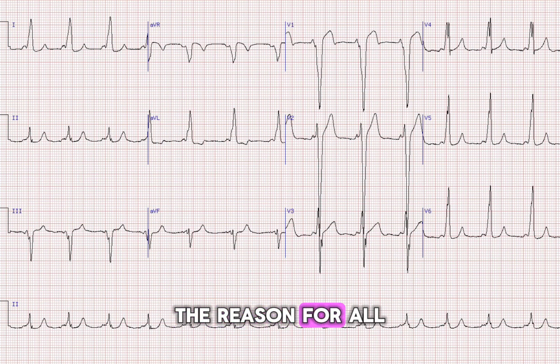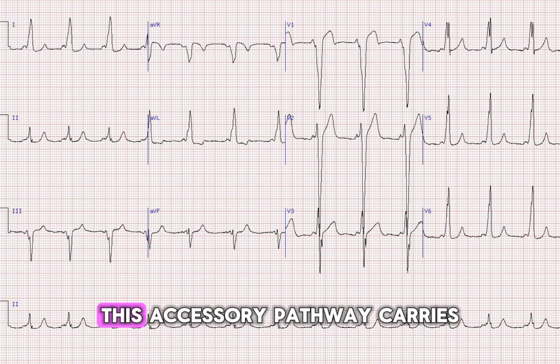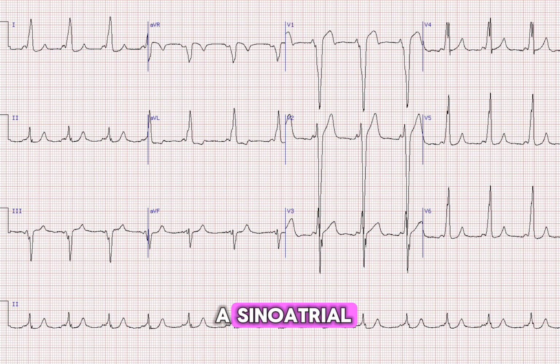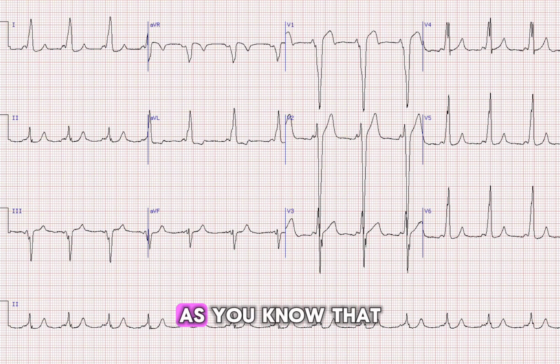Now, the reason for all of these changes is the presence of an accessory conduction pathway between the atria and ventricle. This accessory pathway carries the impulse originating in the SA node through the atria into the ventricle, bypassing the normal AV node. As you know, normally there is a delay in the AV node of around 120 milliseconds.